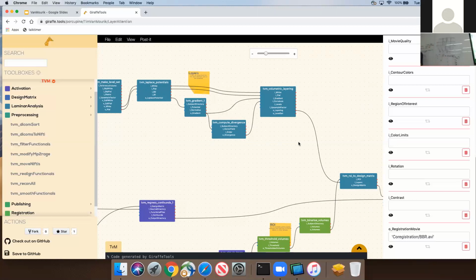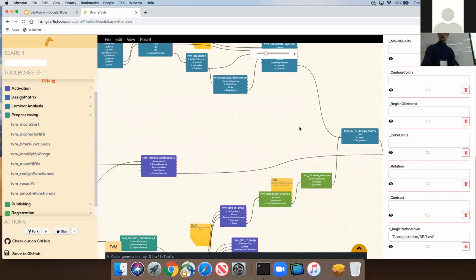Well, our experience is that with 0.8 millimeter data, which is also what I just showed you, 3 layers could work. More is not really going to work. As soon as you have 5 or 6 layers, then you see those artifacts to be so clearly visible that, well, it's end of story. Nothing informative will arise from that.